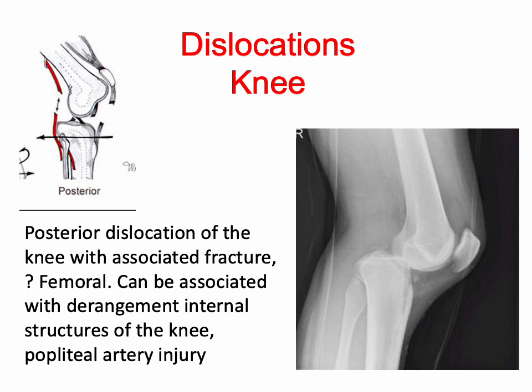Again, posterior dislocation at the knee, and this is important because we have pretty important popliteal arteries running just behind the knee here. So there's potential for injury to the popliteal artery. So it needs to be reduced.